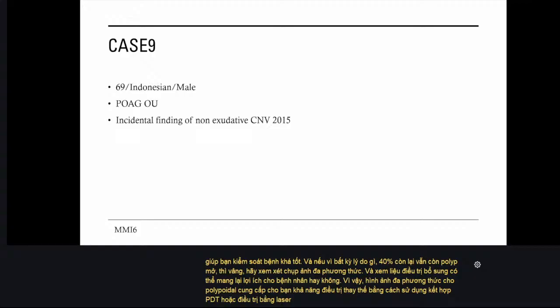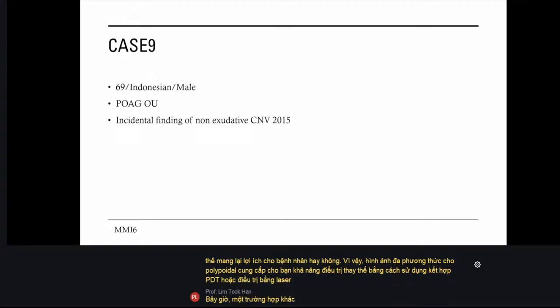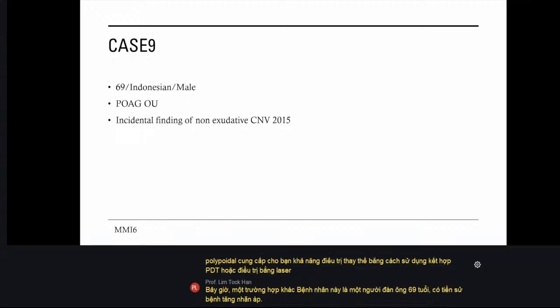Now, another case. This patient is a 69-year-old male, history of glaucoma, and incidental finding of non-exudative CNV, some 11 years ago.